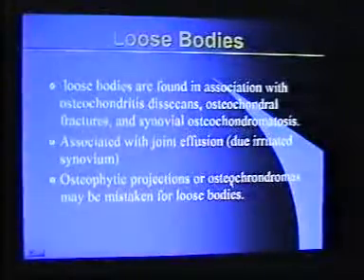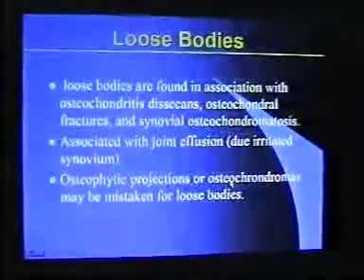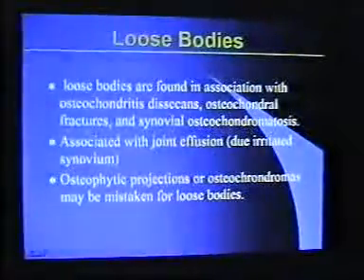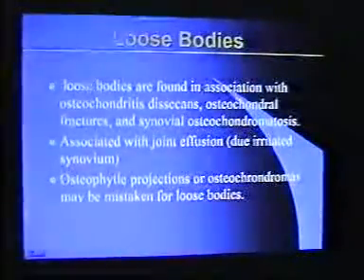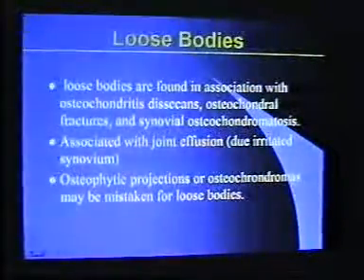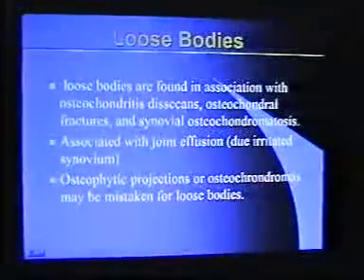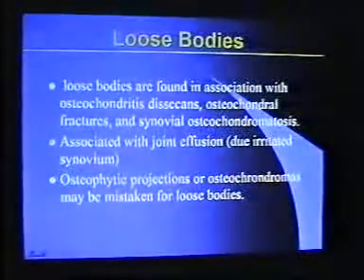Loose bodies are found in association with osteochondritis dissecans, osteochondral fracture, and synovial osteochondromatosis, associated with joint effusion due to irritated synovium.